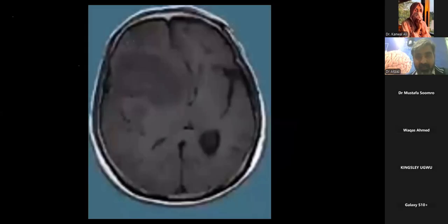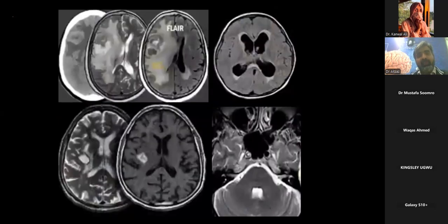Look at here. And this is the T1. In T1, what could be hypointense? It is very easy. The chronic lesion, edema, CSF, cystic lesion, these will all be hypointense on T1. This is T2. So again, we are going through it. This is the edema. What kind of edema? Vasogenic edema. What is this? Hydrocephalus.